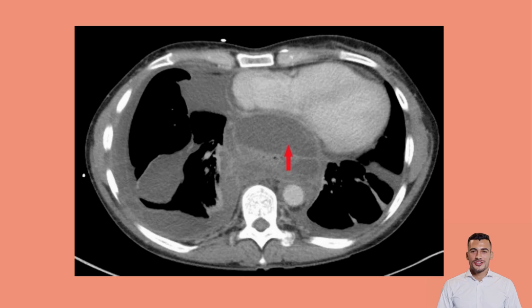Now, there is a curious thing about pseudocysts. They can be seen at very far off places in the abdomen. And not just that, they can extend superiorly into the mediastinum and even up to the neck. Here is such a case showing a pseudocyst extending into the mediastinum, marked by the red arrow.